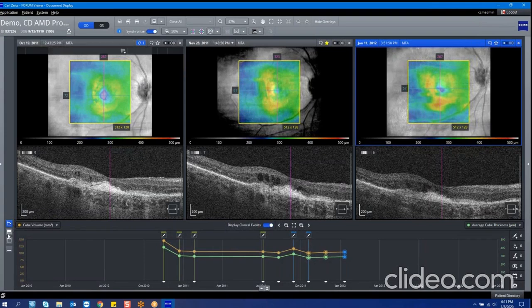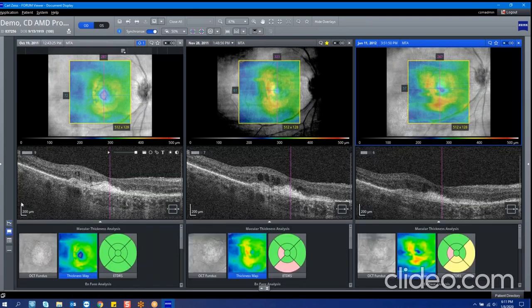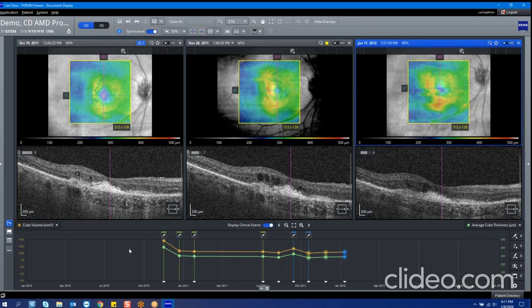So for example, if I had changed it to every time I log in to default to the overlay, this would be my default view. I can still go back and toggle between these, but this would appear first rather than the chart view.